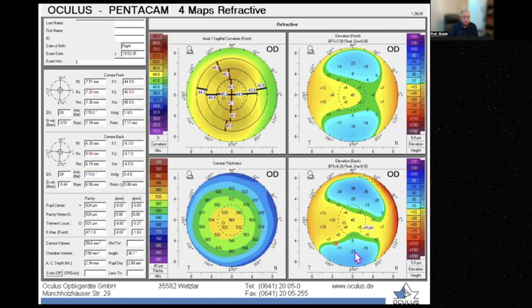All right, this is the right eye. As we see, everything is fine. Of course, we have to look at the shape of the corneal thickness. No need to look at numbers here. Just look at the shape, whether it is concentric or displaced downward, like a dome shape, for example, or bell shape, that we can see in pellucid marginal degeneration. All right, but we don't look at numbers or opposing points anymore because there is no evidence for that.